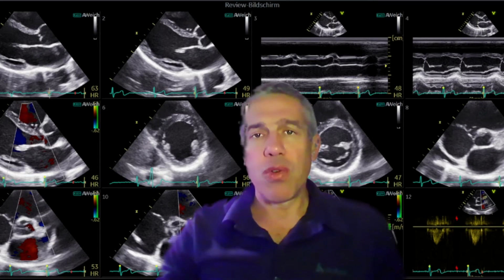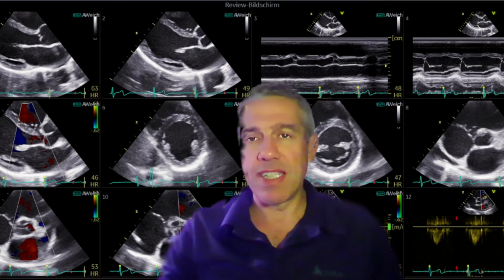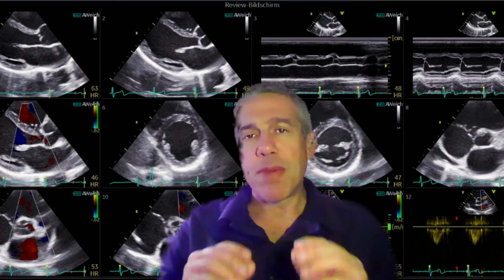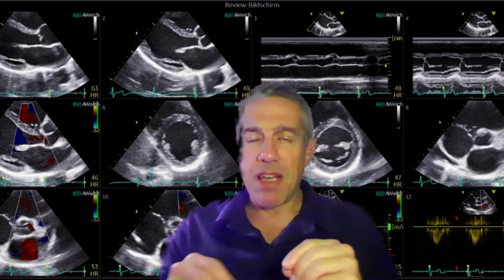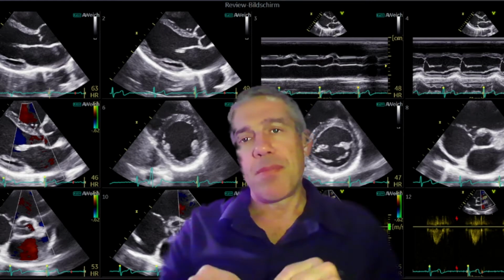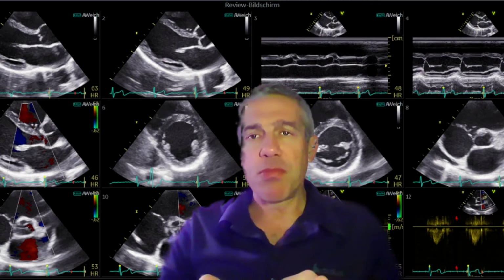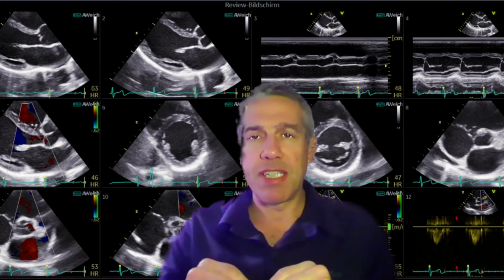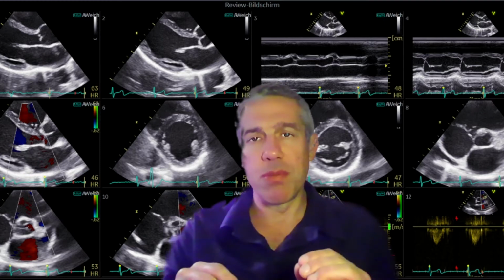We will also look a little bit at Doppler ECG tracings, which can also give us an idea about the effect of resynchronization. Now just a little bit to the background of the patient as it was told to me. He was implanted 5 years before at a university hospital center. He had a non-ischemic cardiomyopathy, left bundle branch block morphology, and at the time of implantation an ejection fraction below 30%, between 25 and 30%.